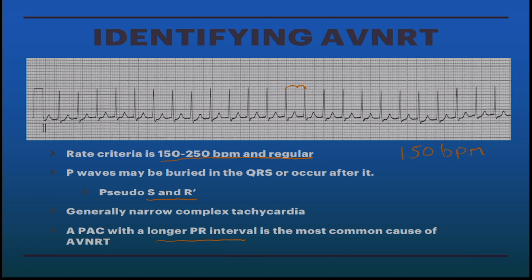You can look at it and tell that it's very regular. Okay. Do I see P waves? First glance, I'm going to say no P waves. I don't really see them. PR interval, absent. P to QRS ratio, absent. QRS complex, narrow.